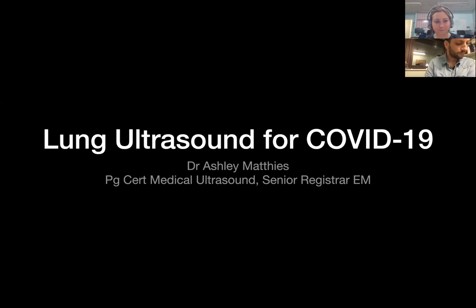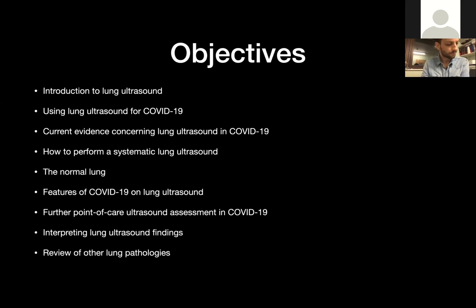Cool. So we'll mainly talk about lung ultrasound for COVID since we're back in the midst of COVID. But we'll talk a little bit about some other lung ultrasound pathologies as well. And we'll talk a little bit about the evidence, why we're using lung ultrasound in COVID, and how we're using it.